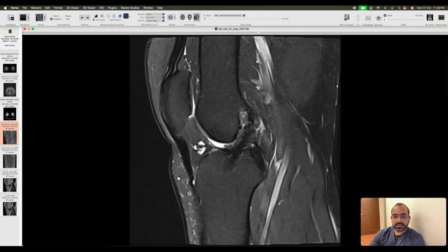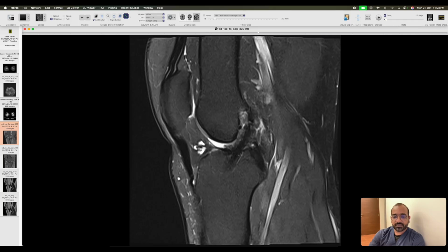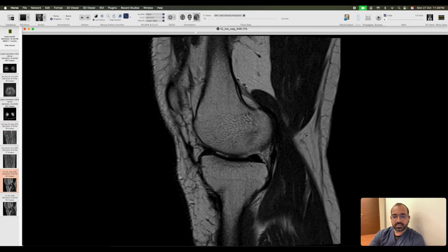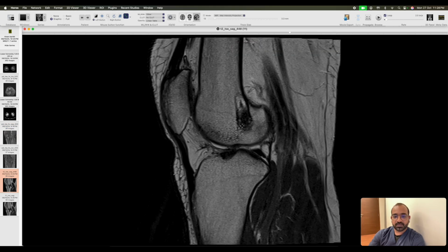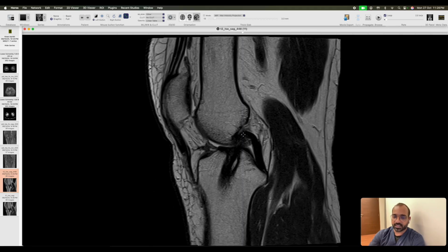And what about this segment of the ligament? It shows intermediate to normal signal intensity. On T2 weighted images, even in the femoral tunnel, the ligament appears normal in signal. So in this, we are able to see early signs of small graft ganglion formation.